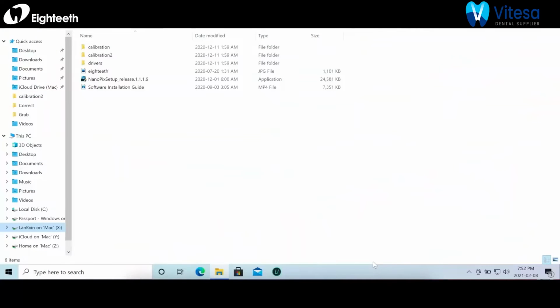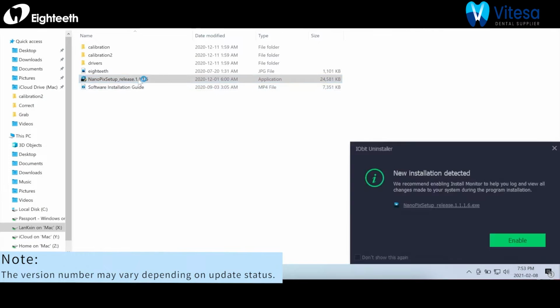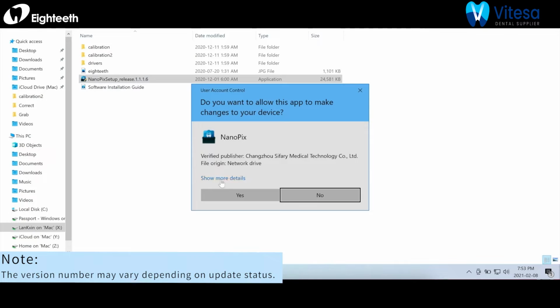Okay, let's get started with installing the software. After connecting the USB key, you can go ahead and click the installation application. This program is super small, and honestly, it's as simple as 1, 2, 3 to install it by yourself. The installation takes only about 3 minutes, and then we're ready to rock.